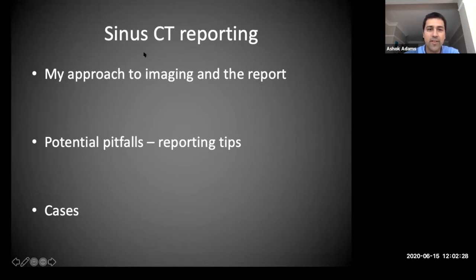So what do I do with the sinus CT? I'm going to tell you how I approach reporting them, give you a few reporting tips and potential pitfalls, and as I said, I've got a selection of cases that we can go through just to show you some relevant pathology.